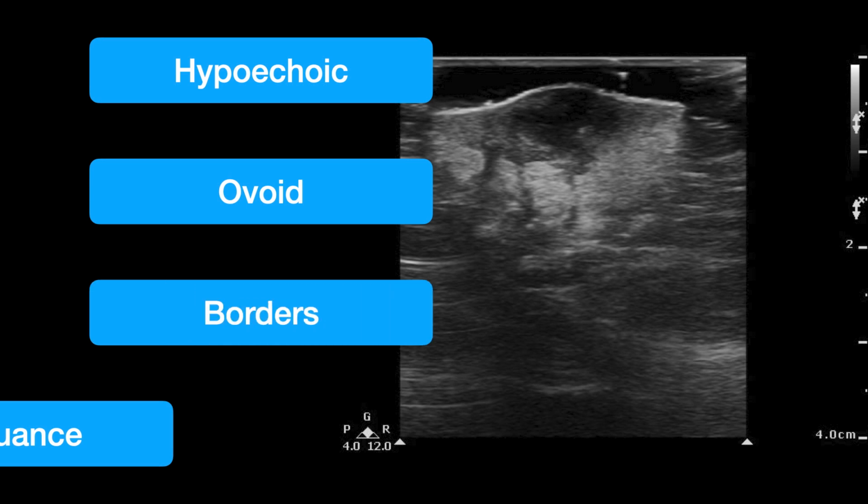The third characteristic is this idea of irregular borders, right? We'll talk in future weeks about cystic structures, and one of the things you'll notice about cystic structures is they tend to have very smooth, well-demarcated borders. I mean, it's a cyst, right? That's the definition of a cyst. It's got this bordered thing and there's something in it. An abscess is not that. An abscess does not have that shell. An abscess is basically a lake of liquefied material that's kind of growing, right? As more material gets inflamed, as more necrosis happens in the tissues around it, that lake grows. And as you can imagine, there's nothing containing or confining that except for the integrity of the tissue around it. And so it's going to have very irregularly shaped borders, with these tendrils moving different places, right? And that's going to help differentiate it from other subcutaneous lesions.